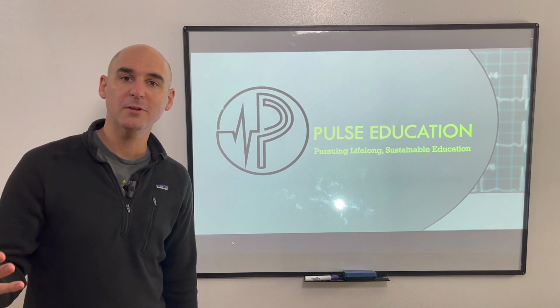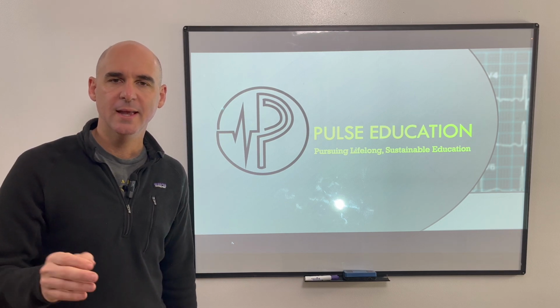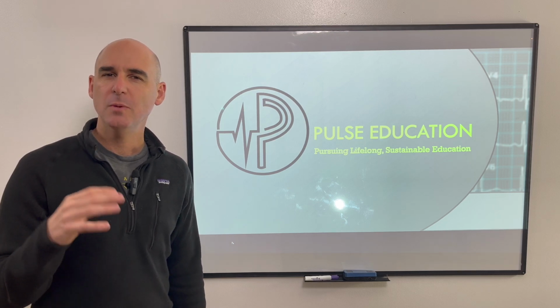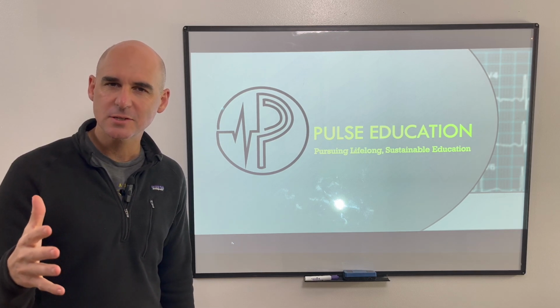Hopefully you have been following along in our series of videos that we've been doing on taking a disciplined approach to 12-lead interpretation. And specifically the last few videos, and this one included, are specific about axis determination. And you may be wondering why we're spending so much time in so many videos specifically on axis and all the nuances of axis determination.